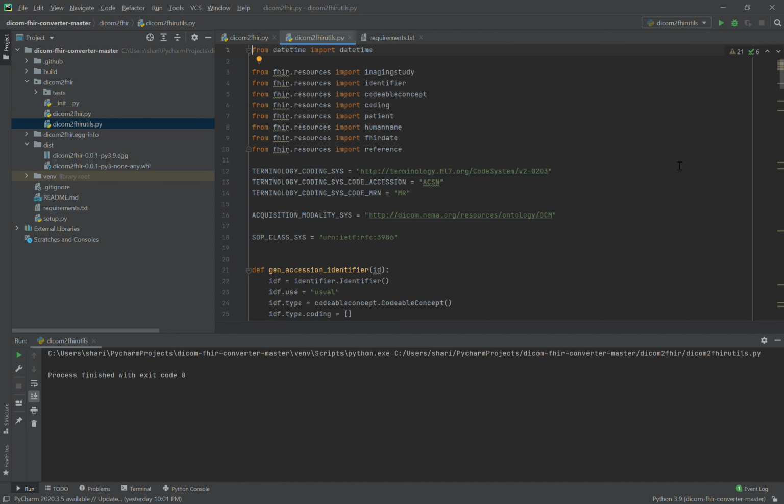And what the library does is it processes all the files within that directory. It does expect that the directory will only contain files from a single DICOM study case and not multiple cases. If it does find something like that, it would throw an exception. But if it's not able to read a file, it will just keep on skipping the files and move further down the study.